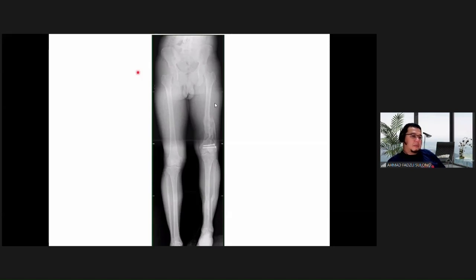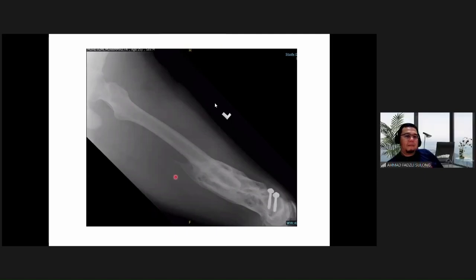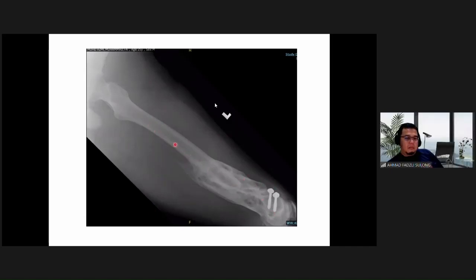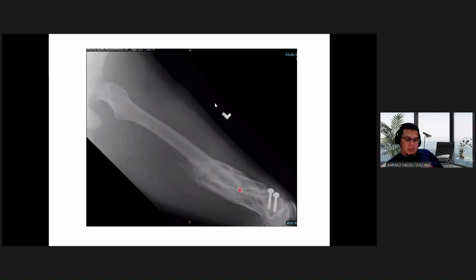Angulation, dia punya reference apa? Reference there, the position of your. Position of. Okay, katalah this one. Right. Ni ada angulation tak? Slight angulation. Angulation mana? Distal ni pergi mana? Distal tu anteriorly. Pergi ke depan. So macam ni, macam tu. Okay, good. You nampak tu.